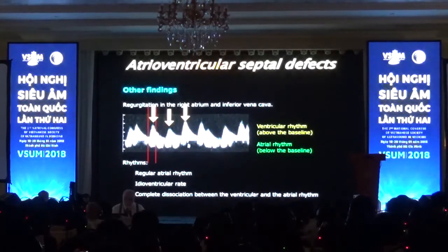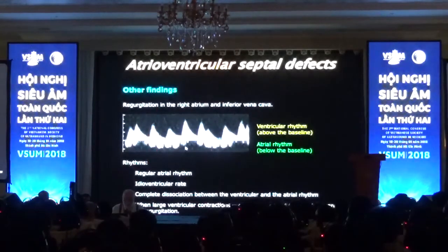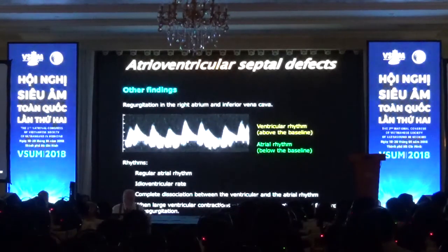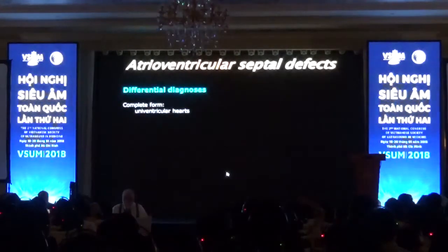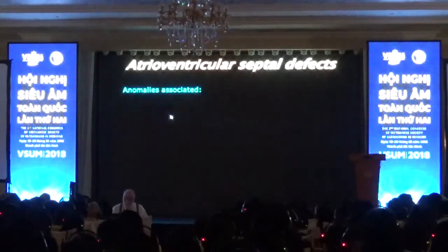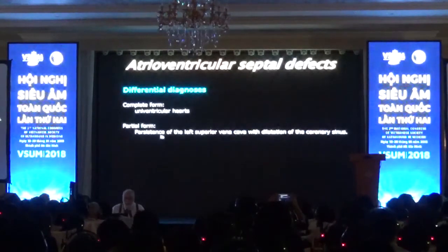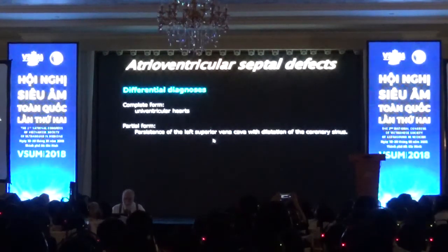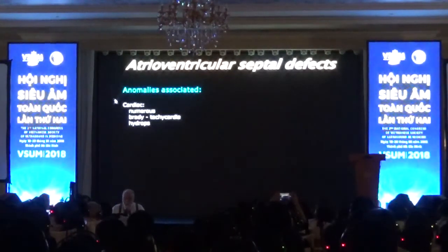And not only that, but you can see that when there is a very big ventricular contraction, you interrupt the atrial flow, so you have a large amount of regurgitation. So even from this simple image, you can deduce that the baby has the complete form and therefore most likely trisomy 21. The differential diagnosis is with the univentricular heart and the partial form. You can also think about the persistence of the left superior vena cava with dilatation of the coronary sinus. So what are the associated anomalies?